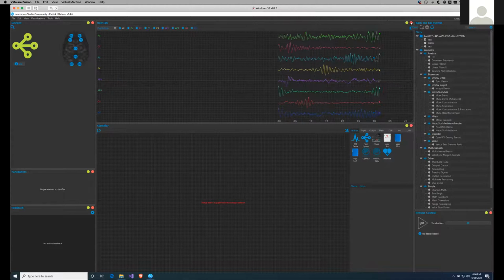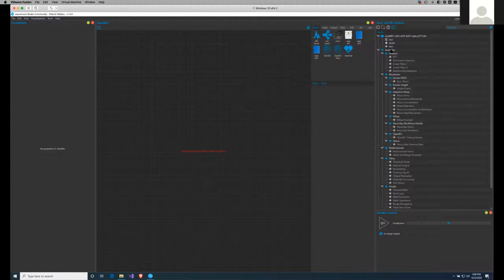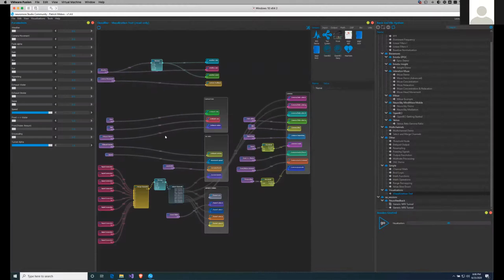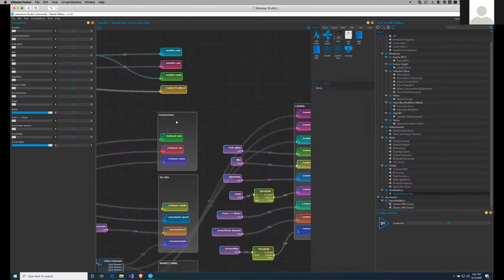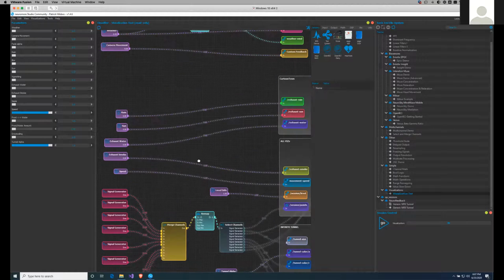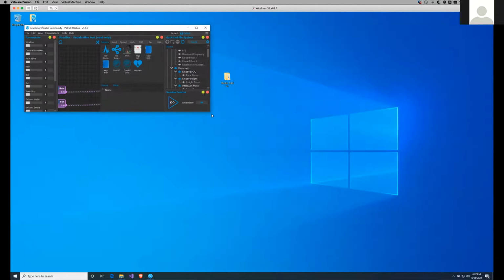And what we recently added here, I just close a bunch of the windows that we do not need currently. Under examples, like every user in his personal file system has an examples folder. And at the end, you will find a new folder, visualizations, and there's visualizations test in it. So if you open that up, you see the visualizations test classifier, and that shows what particular feedback values can be fed into the different visualizations. And as you can see, all of those feedback values are just fed in through parameters. Some of them are also created through Signal Generator. So let me make that a little bit smaller.